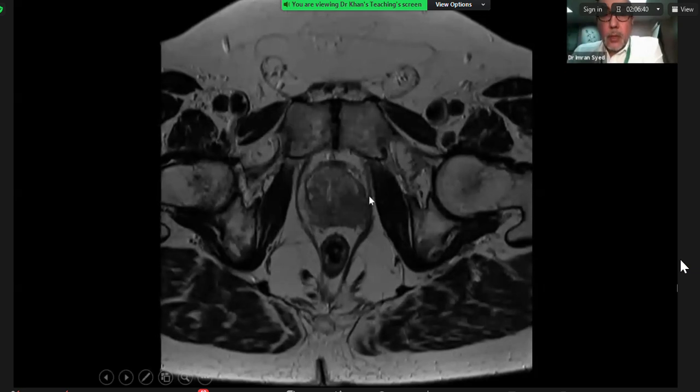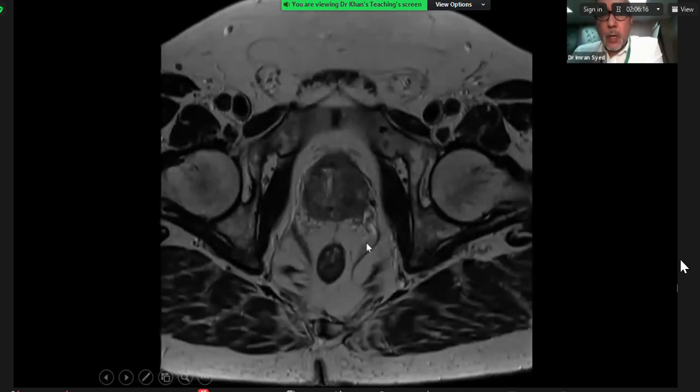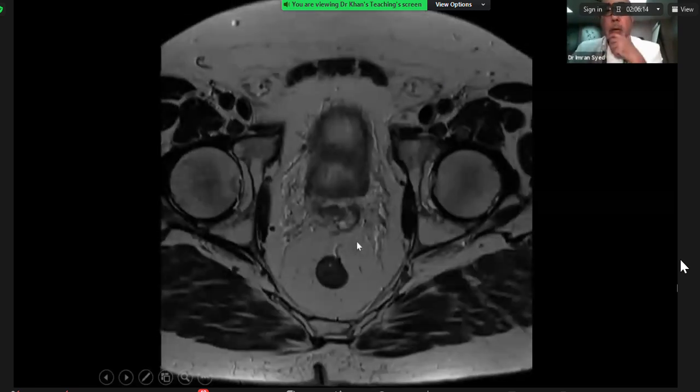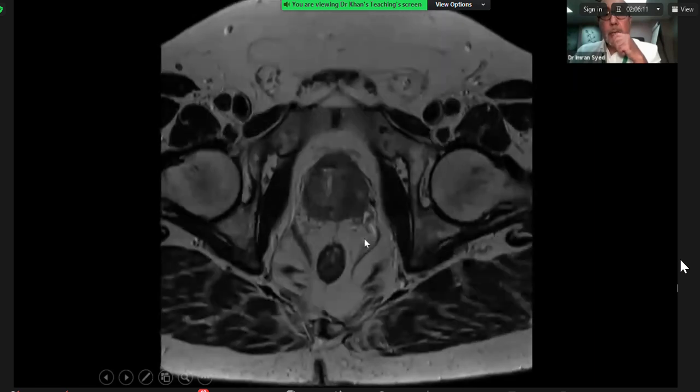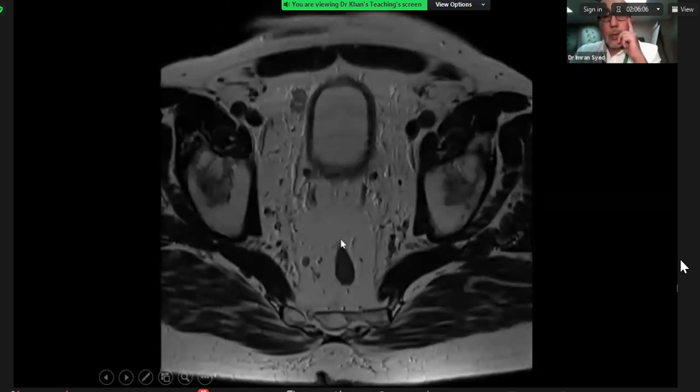The other thing that you can see here, I don't know whether you can see that, but the levator ani muscle on the right side is fine, but on the left side there's an acute angulation. So instead of having that broad curvature, you've got this acute angulation that's been formed, and this is because of tumoral invasion of the periprostatic fat planes, which is causing mass effect locally. So we've got a tumour that's clearly spreading outside, and the question then is, is it invading the seminal vesicles, and what else is going on?